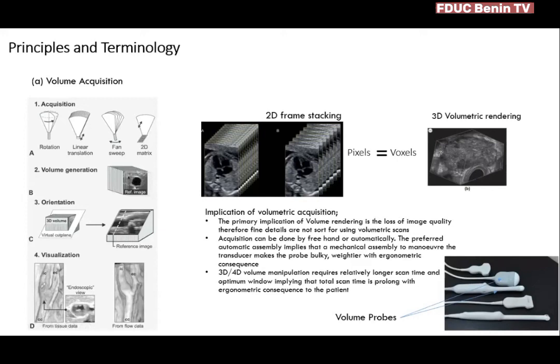To acquire a 3D image, the operator can do this manually or automatically. Previously, in a similar fashion to how you would do your normal stroke across the patient's abdomen, 3D was acquired in this manner. The operator had to steadily move the probe across the anatomy of interest until the anatomical area of interest was covered, and then the machine processes the image as a volume set.